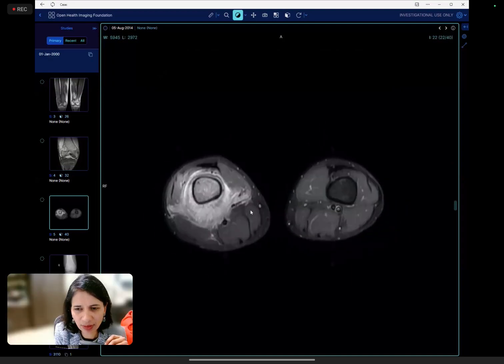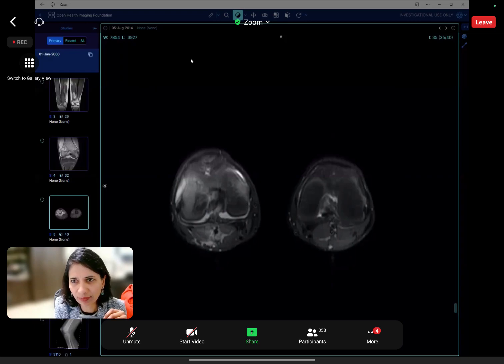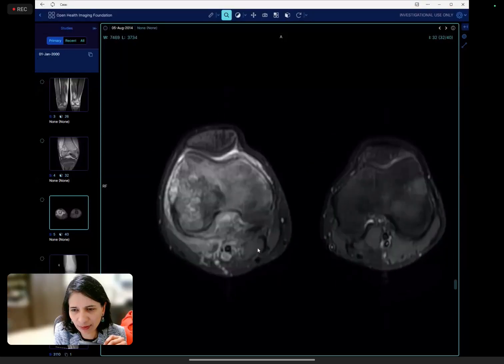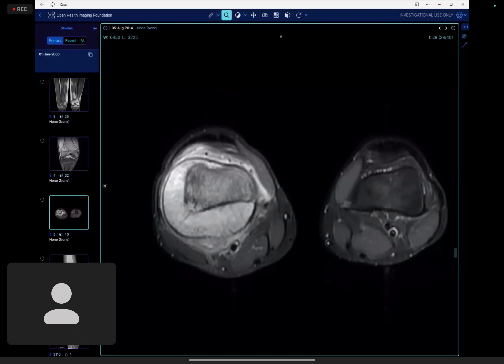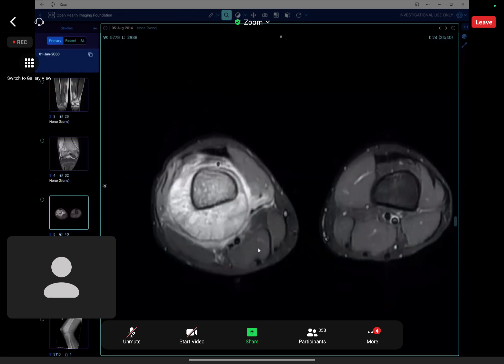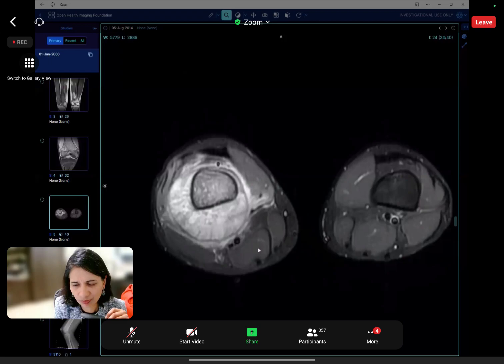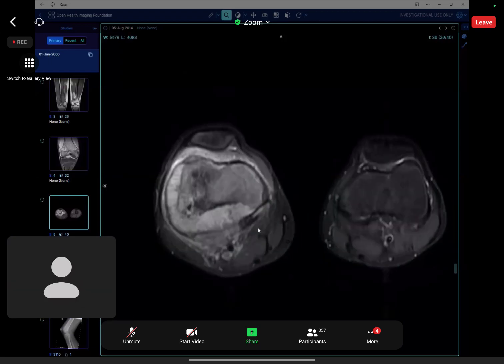I mean, your time is up, but we will look at this case. So you can continue describing. If I zoom this in, these are the axial images. Yes. So there's significant surrounding bony edema, and it has a well encapsulated soft component. It's high signal on fluid sensitive images. This could represent a chondroid lesion.